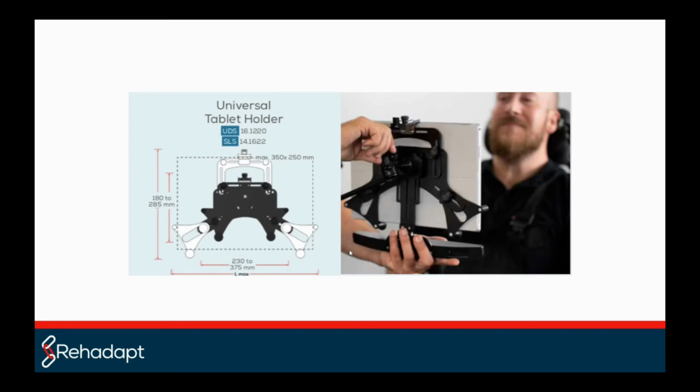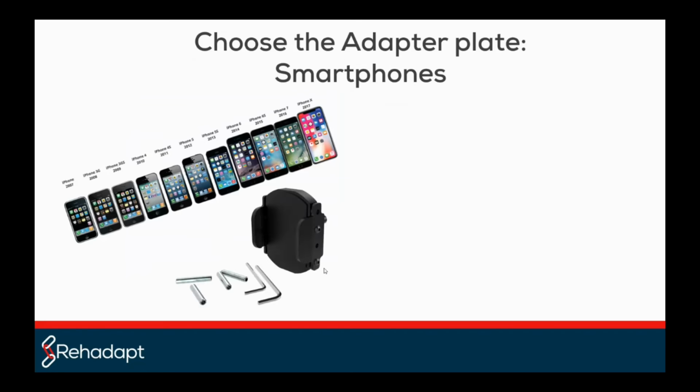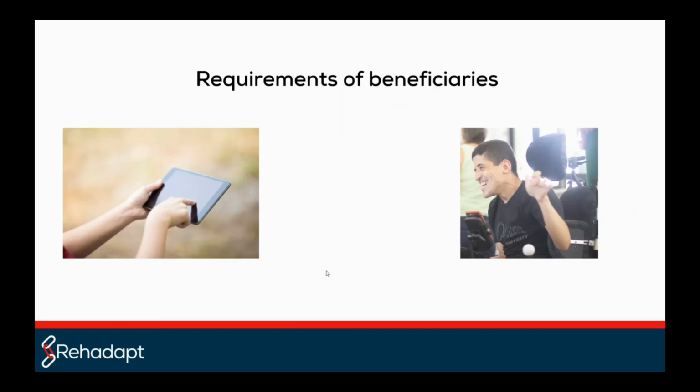And we provide different kind of adapter plates to combine them, for example, with the Hero eye gaze systems from iRespond, or with other eye gaze cameras in combination with tablets and iPads. So you have all different kind of options also for smartphones, such as the universal phone holder to access also the communication systems, smartphones, tablet next to each other on a customer's wheelchair.